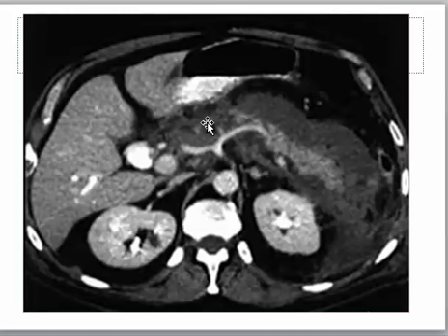Here the pancreas itself is enlarged, definitely edematous, and air foci are seen, so it is also emphysematous. So this is edematous, necrotizing, emphysematous pancreatitis. Some parts are now lost, this area and that area.